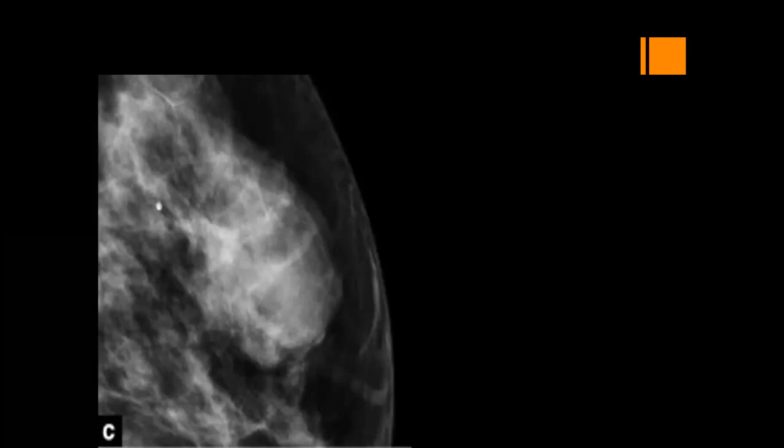No comment. So why did you change your mind? Because there is fat, described as circumscribed, partially obscured, and I shifted you to fat containing lesions.